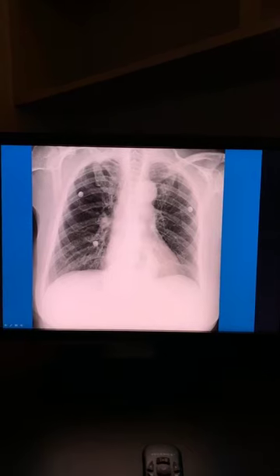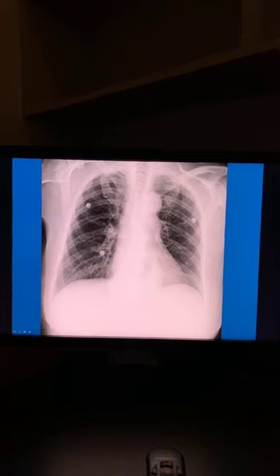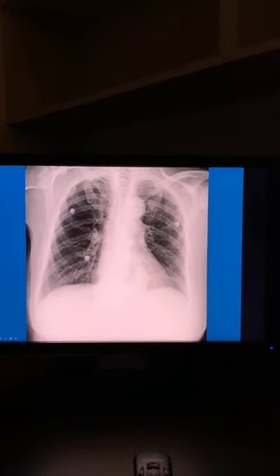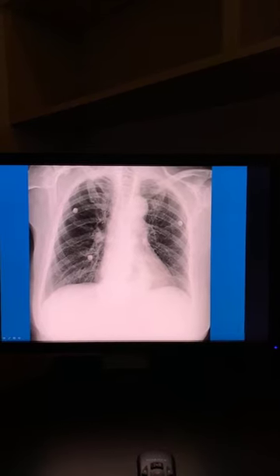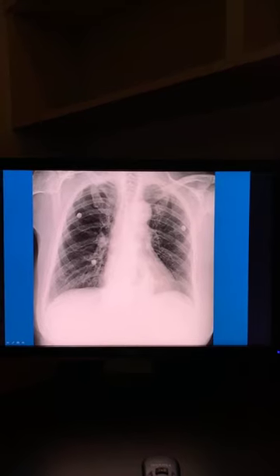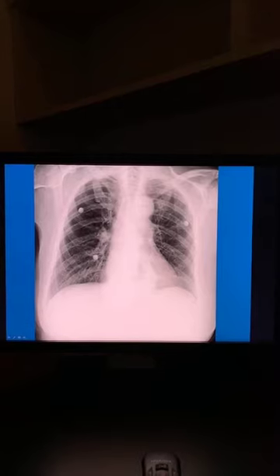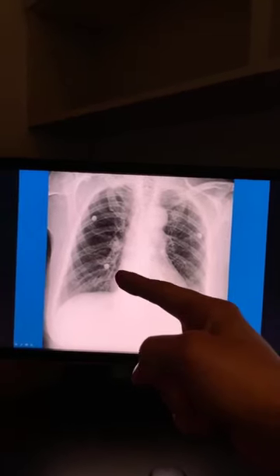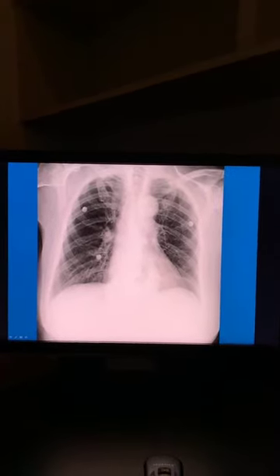What do you guys see? Oh, yes, here we go. This is a tough one. This is a tough X-ray. It looks a little bit ratty. I don't know what's going on. But remember when I kept harping on, look at the heart. Make sure you see that it's not too opacified and it's not too lucent. It's kind of intermediate. What do you think about this heart? Why does it look like it's kind of going over here? What is going on right here? Something's weird going on, right?